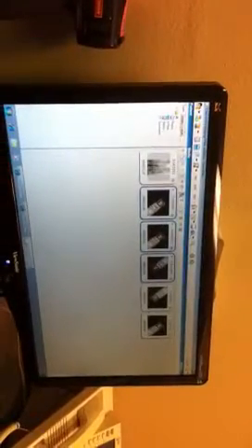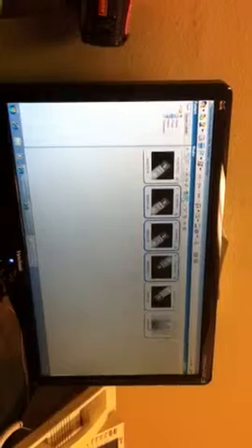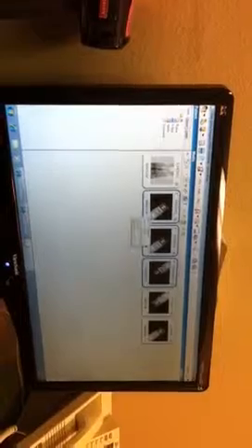So sort by media date. That's the default. That means the newest will be here and the oldest will be down here, so it goes left to right in each row. Sort by name, alphabetically or numerically. So sorted by date or name. Default is the date. That's what most people sort it by. They want to see the newest ones first.